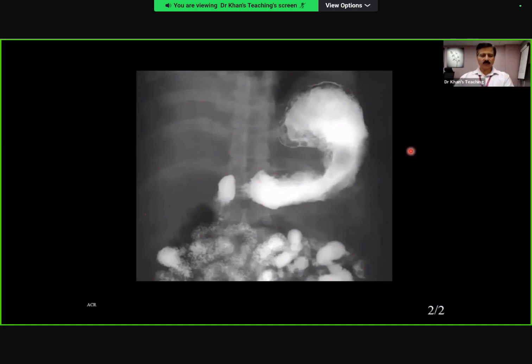Same case. Okay, so this is a barium contrast meal, which is opacifying the stomach, which appears to have a narrow lumen, and there is wall thickening. This is a typical appearance for linitis plastica. So where is that calcification? So that calcification would be within the stomach.